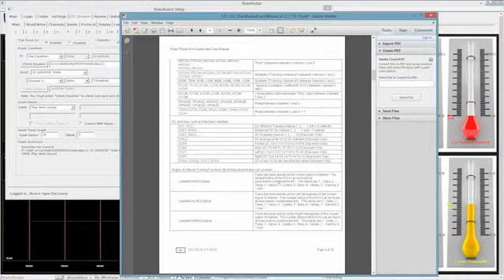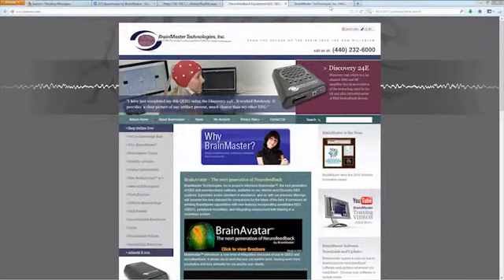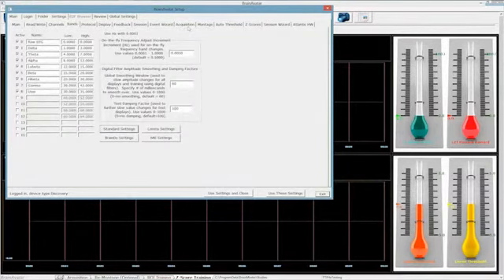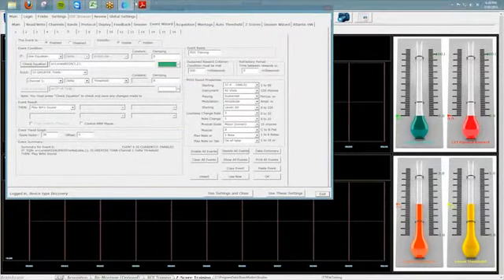This is where the listings for the ROIs can be found, and then the bands, and I gave the basic uses of them. So if we go right here to our knowledge base, these are the different types of implementations you can use to choose your region of interest. For example, the frontal lobe can be implemented as 1, and we know the other one stands for our first band, which is delta. I hit check equation, and it says everything is okay.